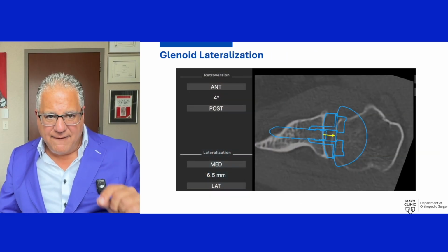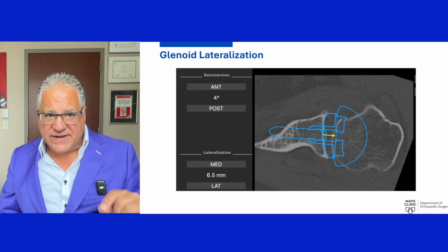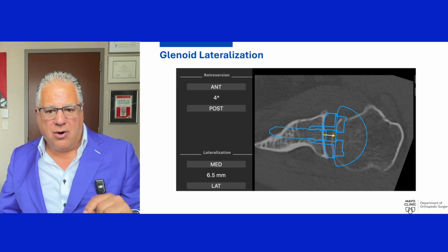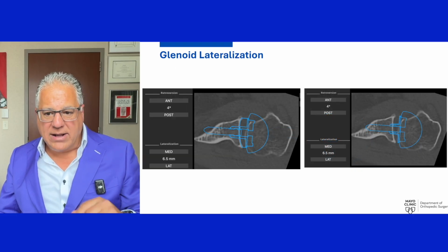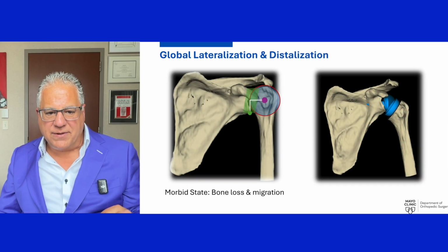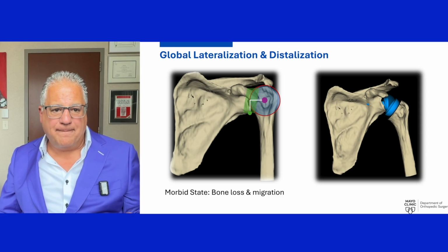And finally, very important, glenoid lateralization in this program is measured as the distance between the surface of the glenoid bone and the base of the baseplate, as you can see here. So in this example, on the right, I placed a lateralized glenosphere. But as you can see, the measurement of BluePrint is going to be identical and will not take into account glenosphere lateralization. Important to understand.